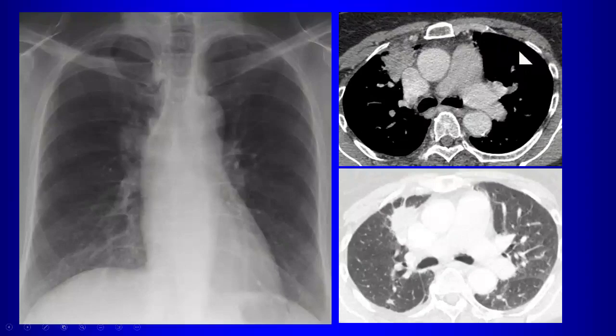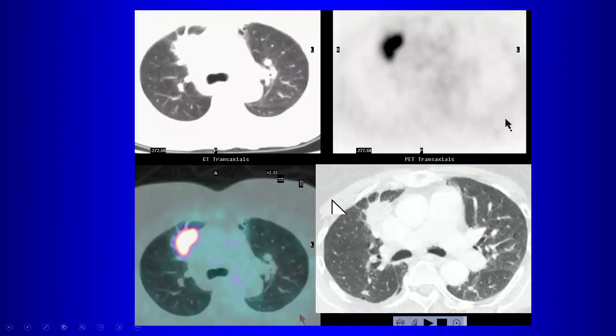Okay. So this patient has a lesion here in the right upper lobe, looks very ugly, goes for a PET scan, and of course it was hot on the PET. The patient got biopsied 3 times because nobody could believe the diagnosis in this patient. Oh, look at that, there's the PET scan. Well, what is this supposed to be? Cancer, right? That should be a lung cancer, right? Is there any doubt that that's got to be a lung cancer? Gets biopsied 3 times because nobody could believe the diagnosis.